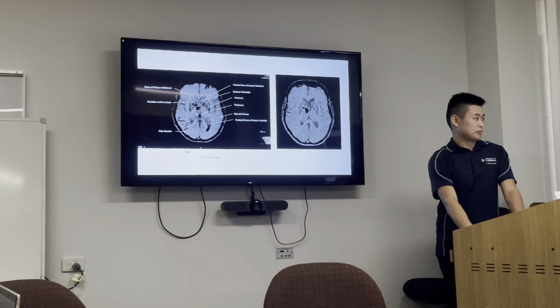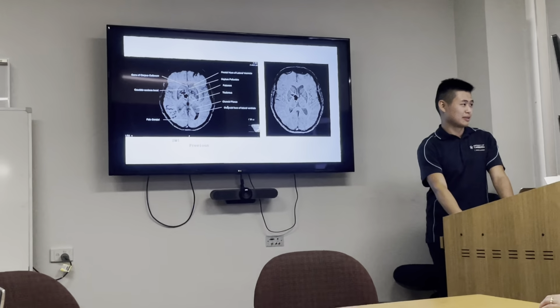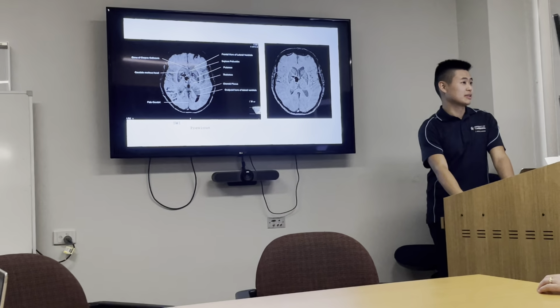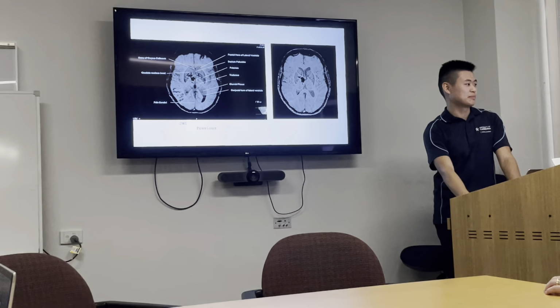So we look here, there is some changes up here, either occipital horn or the lateral ventricle. There is some changes up here as well.